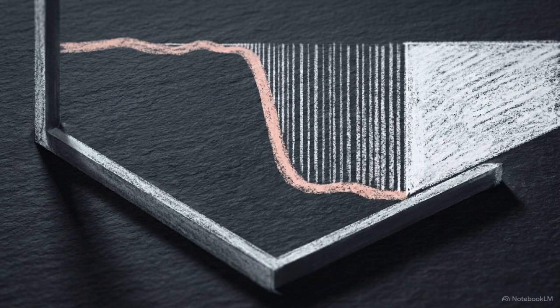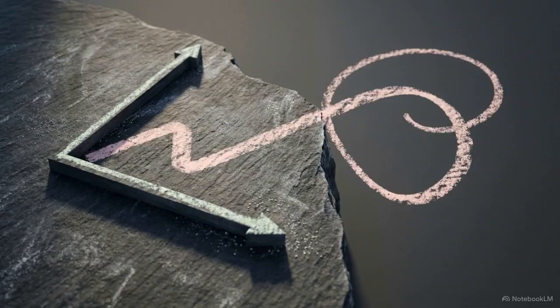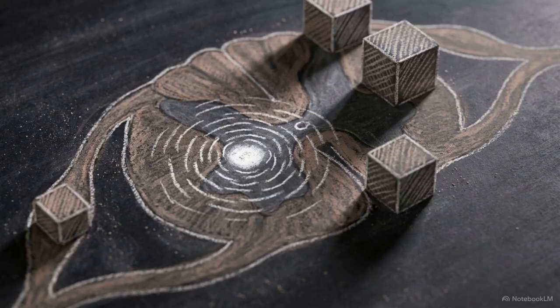To render a sharp boundary between two tissues, the Fourier transform requires high-frequency data points. However, K-space is finite. Truncating the data acquisition before enough high-frequency points are collected makes it impossible for the math to accurately model steep contrast drops. Instead of a clean edge, the truncated data produces a series of superimposed oscillating waves. In spinal imaging, this artificial ringing mimics the appearance of distinct physical lesions right at the boundary between the spinal cord and the cerebrospinal fluid.